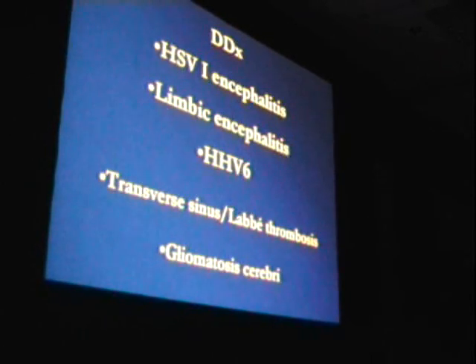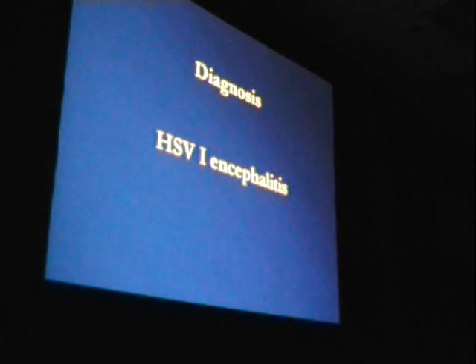So you see this symmetric medial temporal lobe involvement in HSV1 and limbic encephalitis. And this was an example of an HSV1 encephalitis without the petechial hemorrhage, but nevertheless confirmed by PCR.